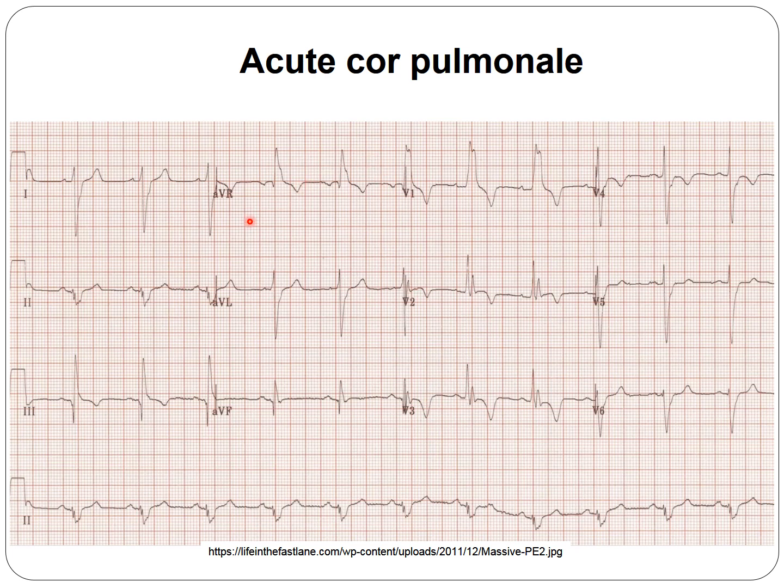This ECG tracing shows a normal rate with sinus impulse formation, rhythmic. The rate is less than 75, around 65 to 70. The P wave morphology is normal. The PR interval is normal. The QRS is wide.